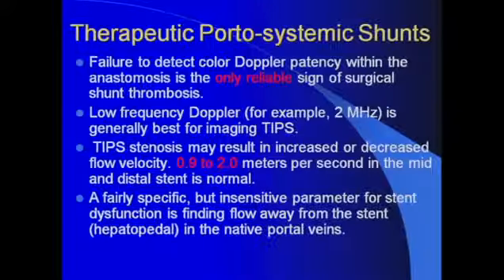The reason why is most of these are covered stents, and these covered stents will have trapped nitrogen air at the time of the placement and procedures that is still not absorbed by the patient, and may mimic or simulate complete thrombosis, as ultrasound has difficulty penetrating through air, which will significantly diminish the accuracy of your study, and you will erroneously give the wrong diagnosis at that point.